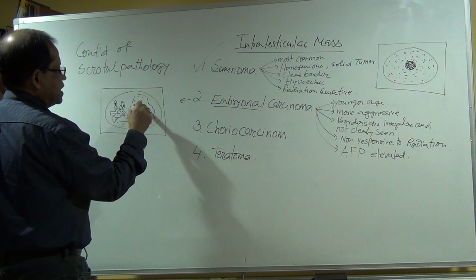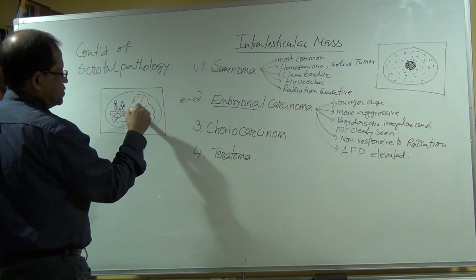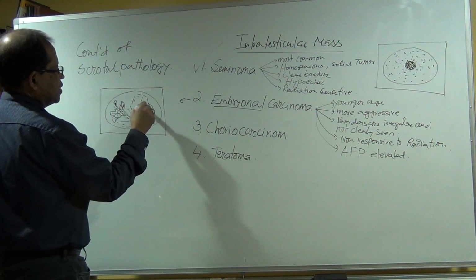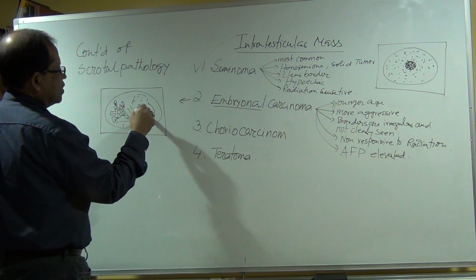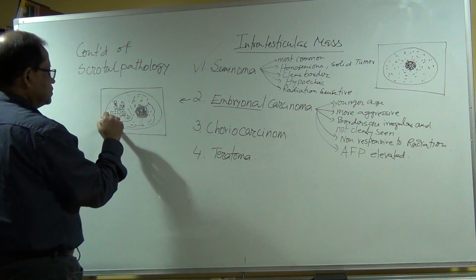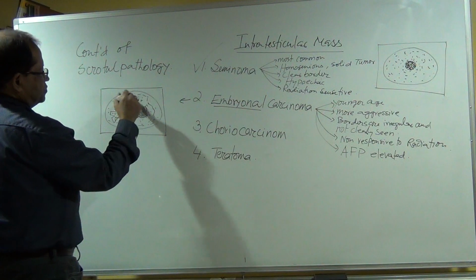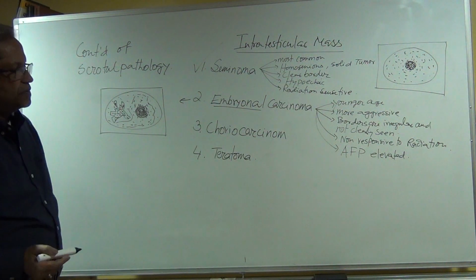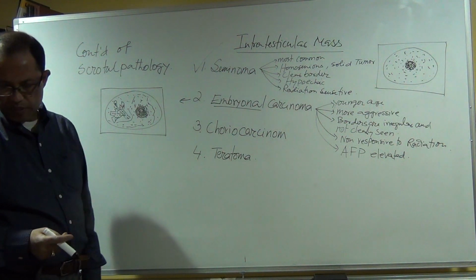And there might be bleeding, hemorrhage. Because it's aggressive. It is aggressive, embryonal carcinoma.